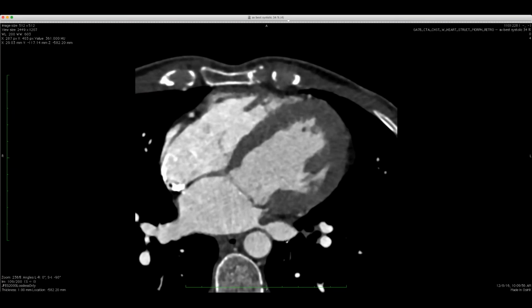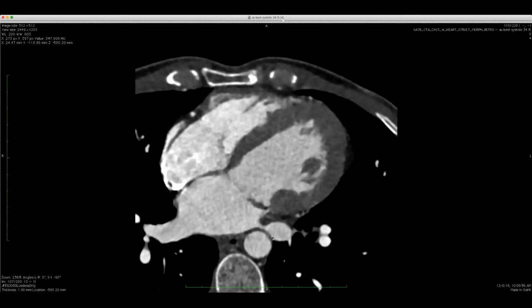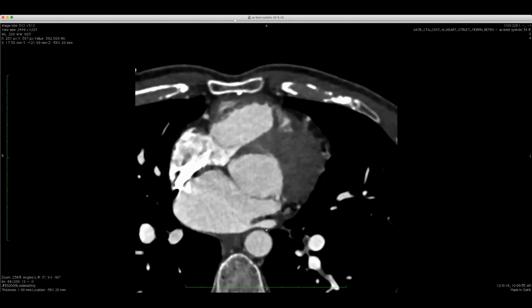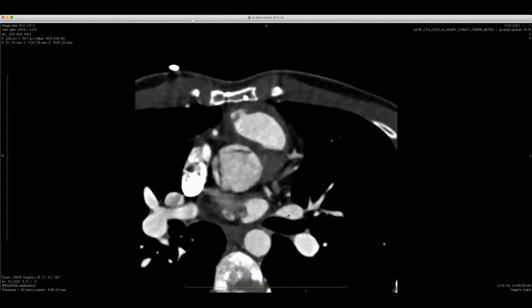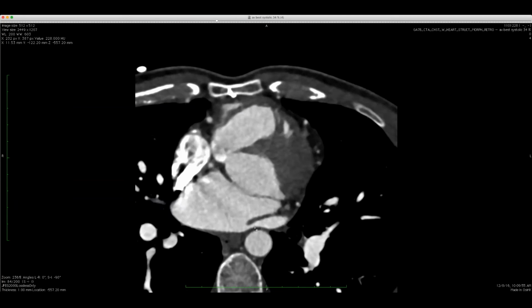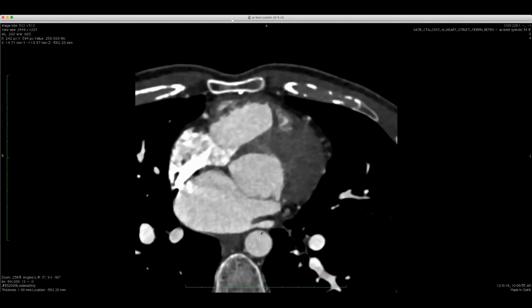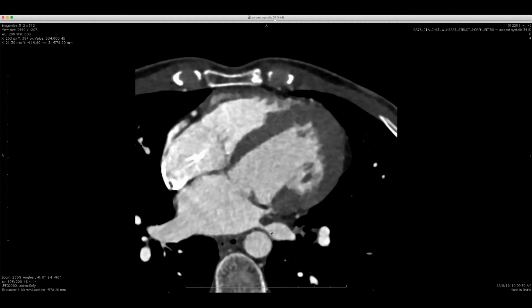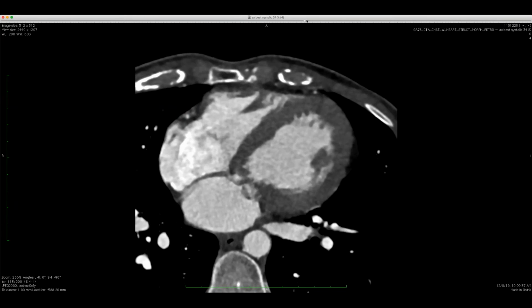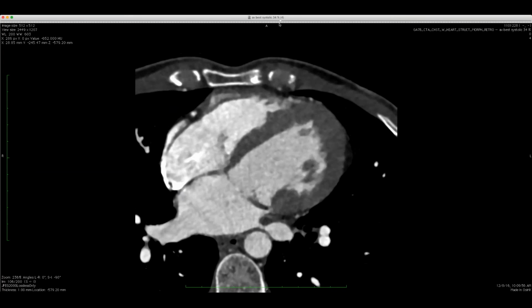You have this very narrow waist, and then you have this dilatation of the remaining pulmonary vein. And then same thing for the superior pulmonary vein here. Just looks dilated here, or even maybe normal size, and then very narrow here. So in this setting, we always think about, of course, pulmonary vein ablation for atrial fibrillation, but this patient had not had that done.